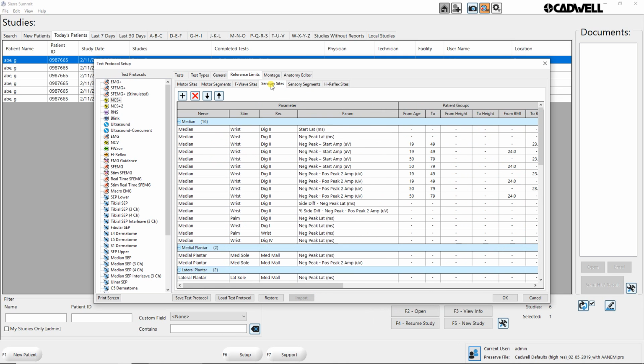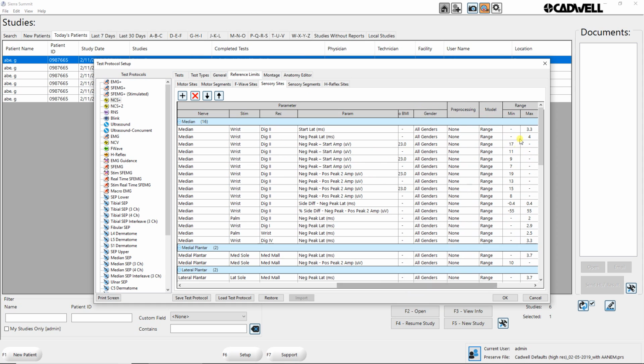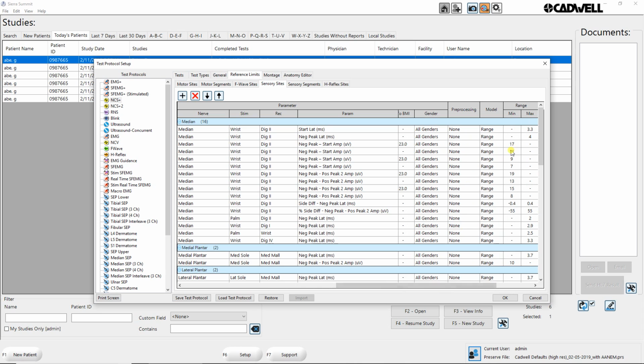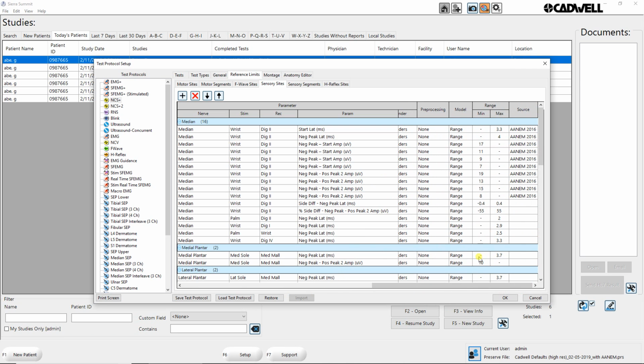For sensory sites, with these reference values, they were using age and BMI for sensory. So here you can see how they set up an age group, 19 to 49, as well as a BMI group. The BMI group was from anything below basically 23 BMI. That was the first group, and that's your reference limit is 17. And then above that BMI for sensories, in that same age group, the reference limit was 11. And then we go down to the next age group, was 50 to 79, and we had 2 BMI groups in that same age group, and those were set up at 9 and 7.